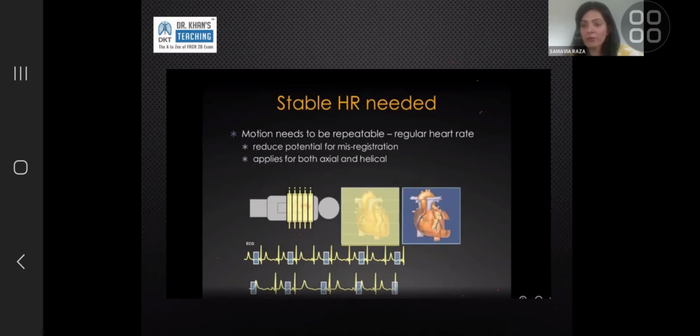So the other thing you can do is the radiographers can manually edit the ECG. For example, if this is how the images are acquired, and this is the irregular heart rate, and I think, well, I wanted to go diastolic. This image isn't really diastolic. It looks like systolic. So I will delete that block. I will then go for that. Something like that. That makes sense. So you can manually edit the ECG, or the scanners are smart enough to recommend that as well. But it can only do so much. If it's ruined all the slices, all the images you have, you can't really do much about it.